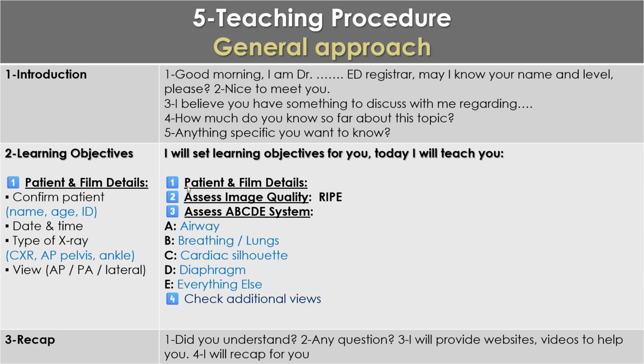Today I will teach you the patient and film details, and assess image quality.